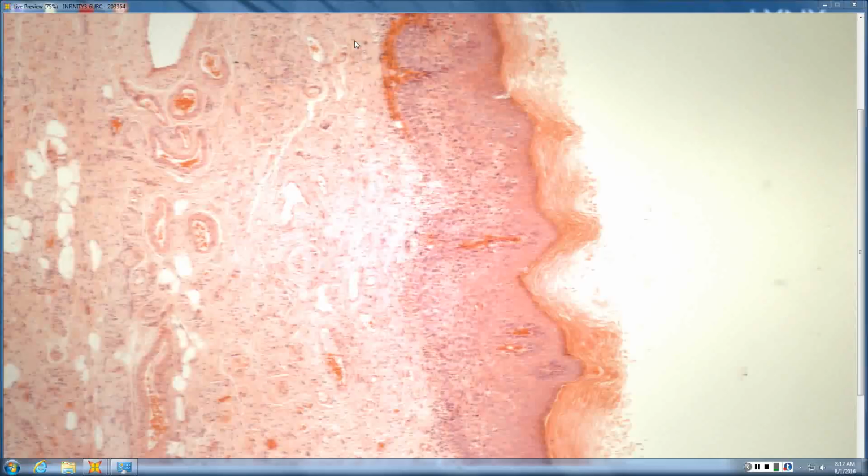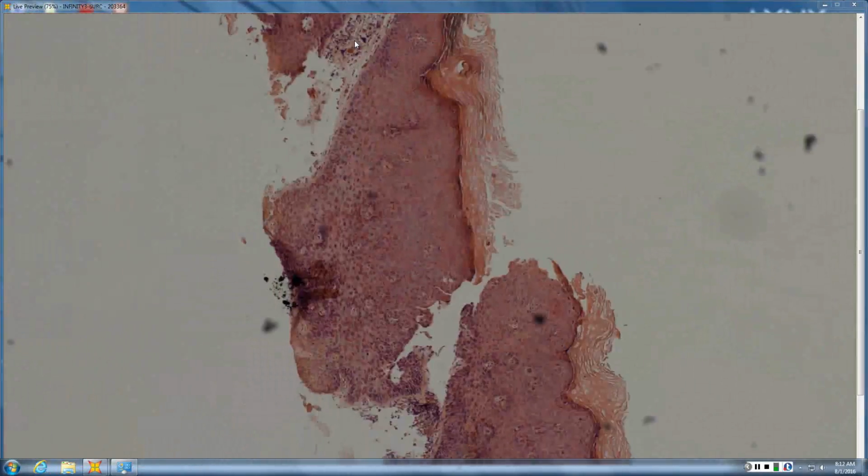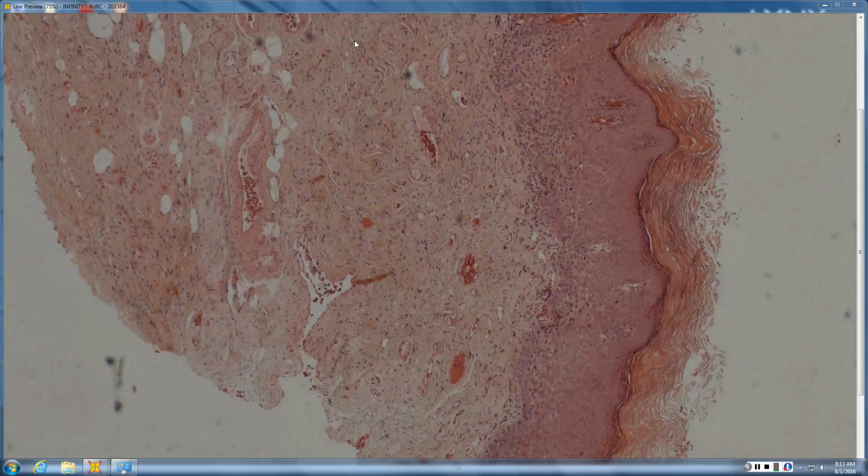To me, some of those areas look normal at the top, but other areas were approaching full thickness. And in some areas, hypergranulosis, your horn is a compact horn with little cookie cutter holes, kind of like a wart. So is this more of a... Probably an HPV-induced Bowen's. Okay.